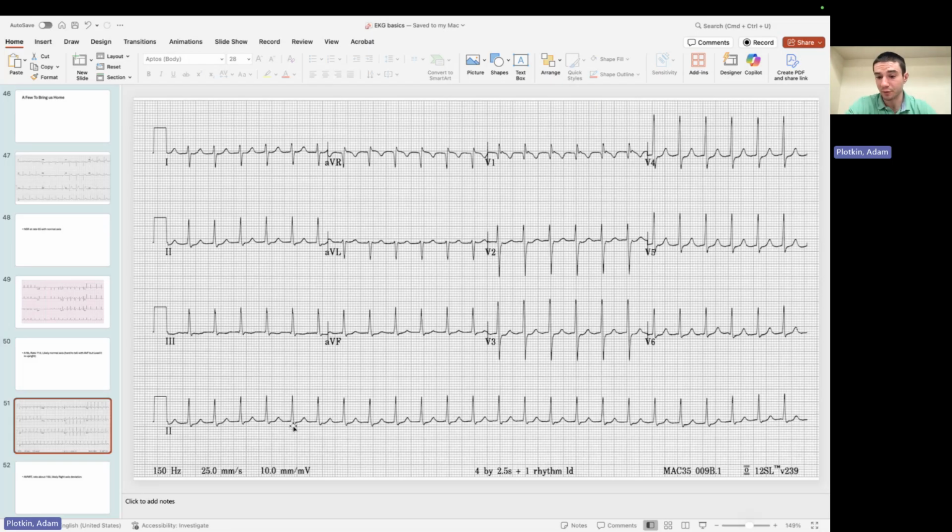I'm going to show you a picture of atrial flutter. This does not look like atrial flutter. It could be AVNRT, which I'm going to teach you the pathophysiology about really quick here, or it could be AVRT. Okay, so AVNRT is AV nodal reentry tachycardia, and AVRT is atrioventricular reentry tachycardia, right? So AVNRT involves the AV node, AVRT does not.